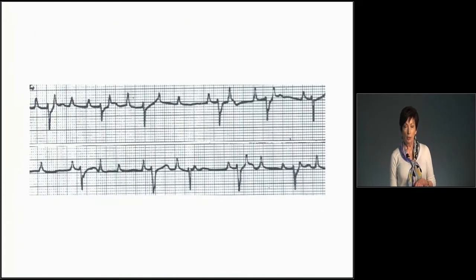All right, so let me show you another example of a multifocal atrial tach. This actually was a patient who was DIG toxic and unfortunately became toxic due to an accidental overdose of IV DIG. And so it slowed the response rate to the Ps, but produced the multifocal atrial tachycardia. And here you can also appreciate the 2 different shapes of QRSs. So here's an example where there's some degree of slowing through the bundles. There's a lot going on here.